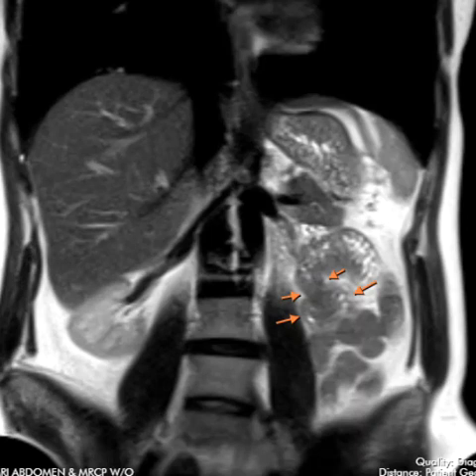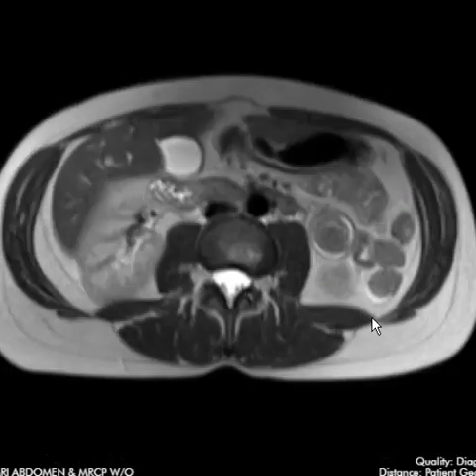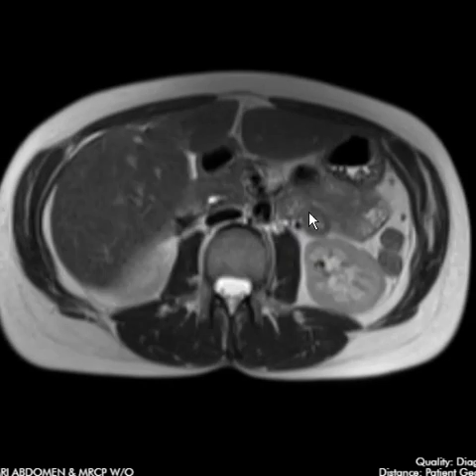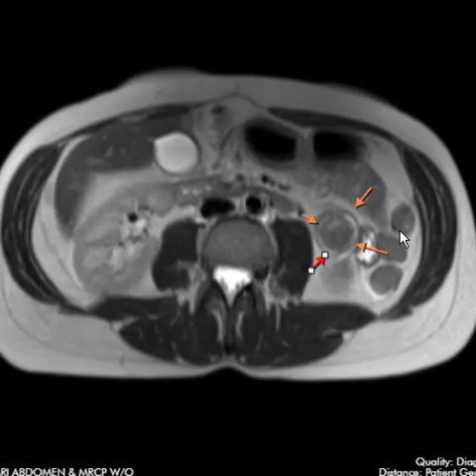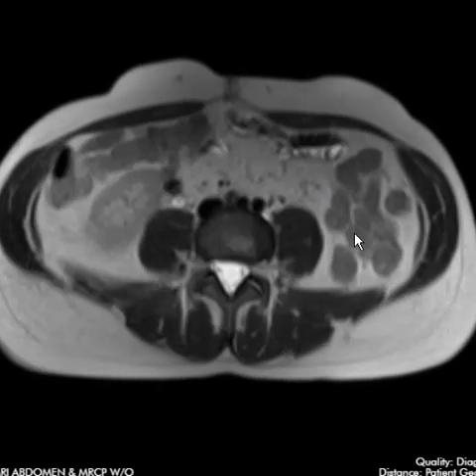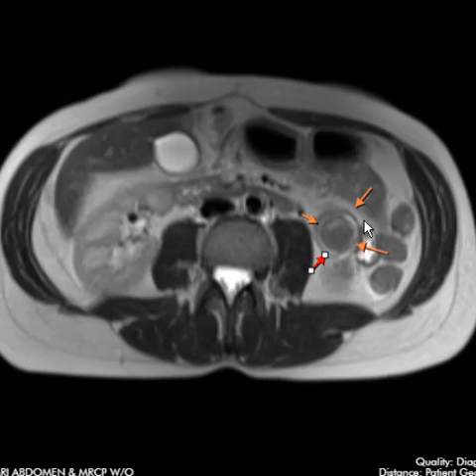So we look on our axial images. I'll slice down here and put on this slice right there. And the axial images also look like an intussusception. If we go up, here's the small bowel loop coming down. We go down, down, down. Looks like the ring there, and then it comes back to a normal morphology. So it looks like a short segment intussusception there, and it doesn't seem like enough to cause her symptoms.